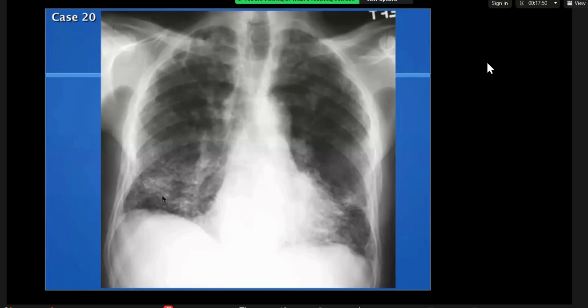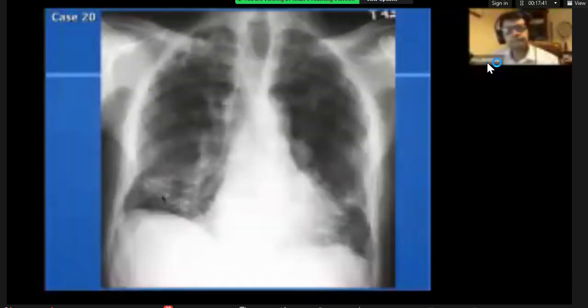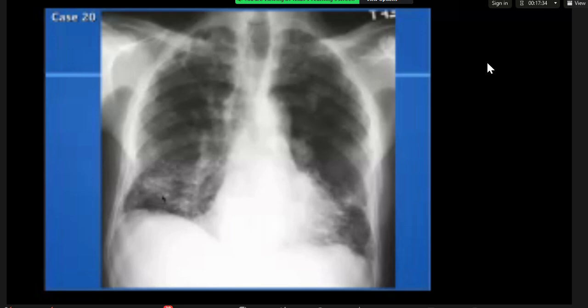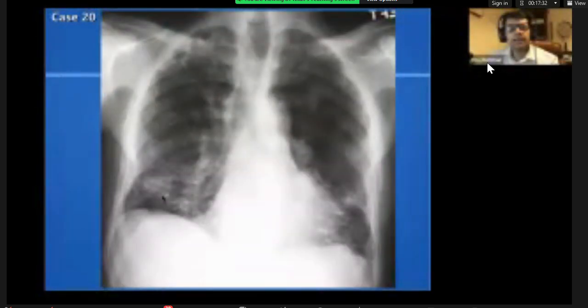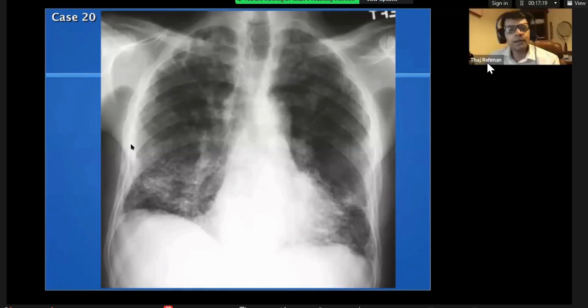So I'm looking for shoulder arthropathy and whether there is any dilated esophagus. I can't see that. No. Bones are fine. Yeah. I'm looking at whether there are any pleural masses, any calcified pleural based lesion. I can't see that either. Are you sure you can't see any pleural abnormality? On further interrogation, I can see bilateral mid zone pleural based opacity. Very good. Are you referring to this one?